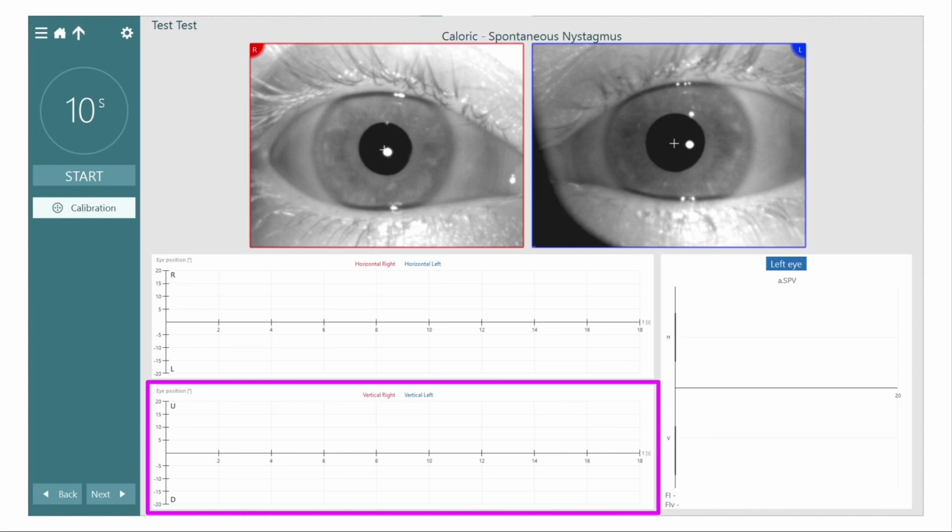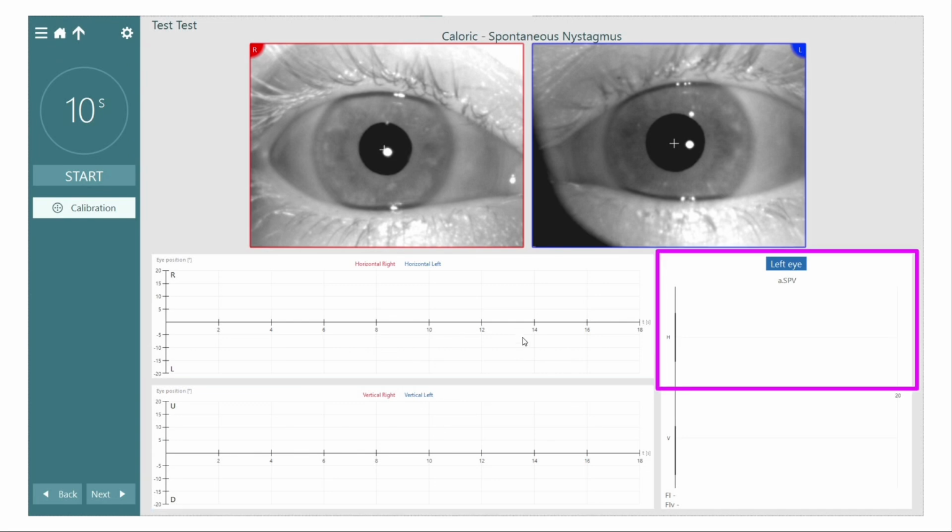And they are always happening simultaneously. So you should see things in both boxes happening as the time goes on. And you can see as we go left to right here where you see the 2, 4, 6, 8, that's your timing. And it will continue to go beyond this and it'll just scoot as you're running your tests.